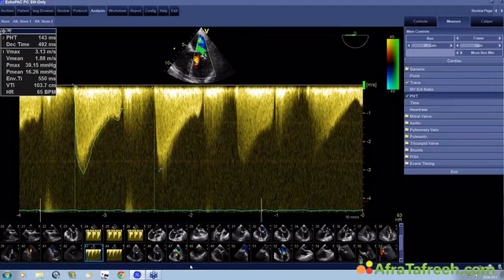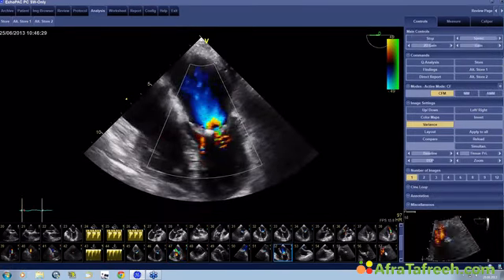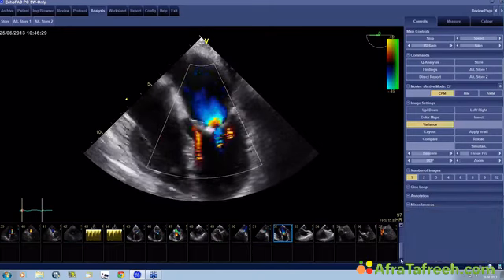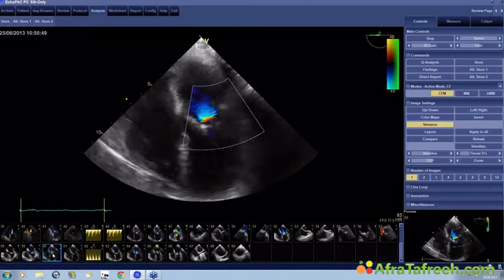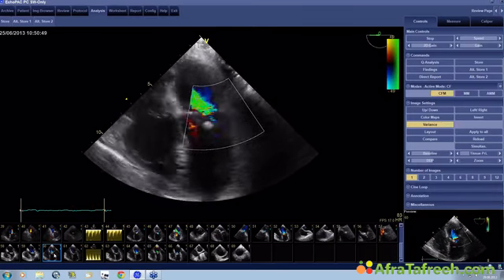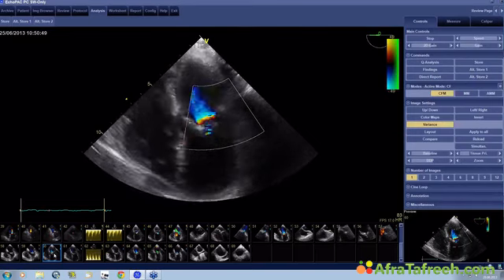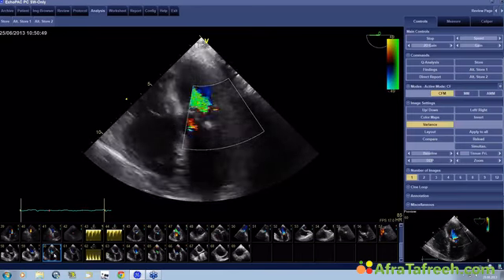The thing is that now we have more volume passing through the mitral valve, and this causes higher gradients simply because of mitral regurgitation. Remember, the blood goes back and forth between the left atrium and the left ventricle. Look at this massive MR we have now. So we are in a situation where we are not so happy, and we discussed what we should do. We were almost about to bring the patient to surgery right away, and then we said, let's just see how she does. Maybe we can stabilize her, and maybe the MR will be okay, and if we do have to operate, we'll plan the operation and see what goes then.